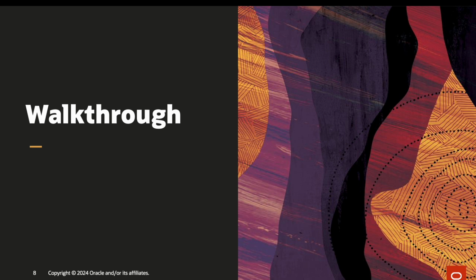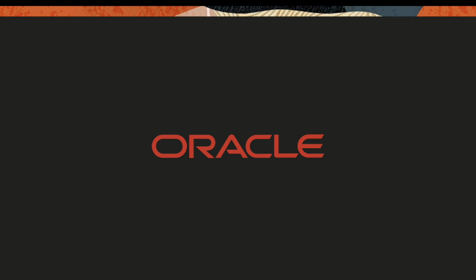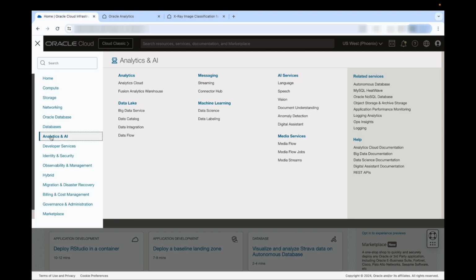Now I will show you the demo first, and later I will walk you through the steps that I used to create this demo. So let's see the demo first, and then I will walk you through the steps on how I created it. Let's click on the left side hamburger menu, going into Analytics and AI services.